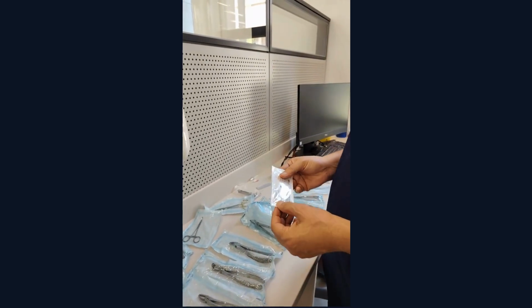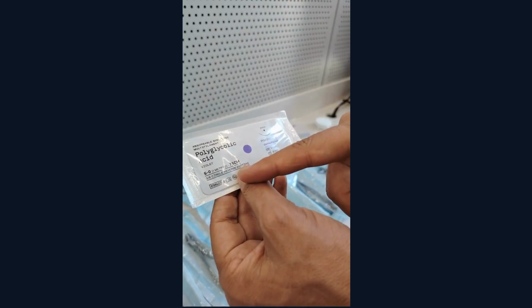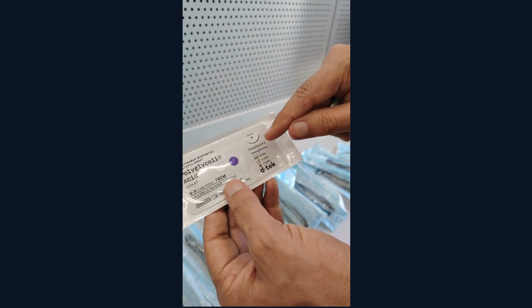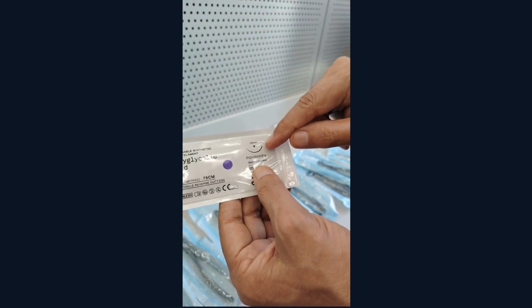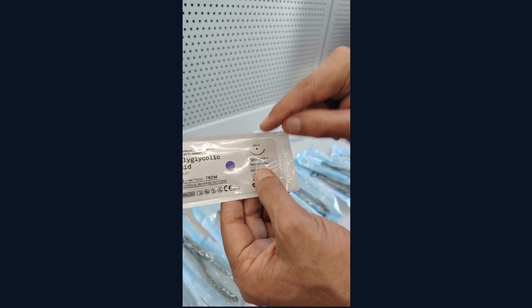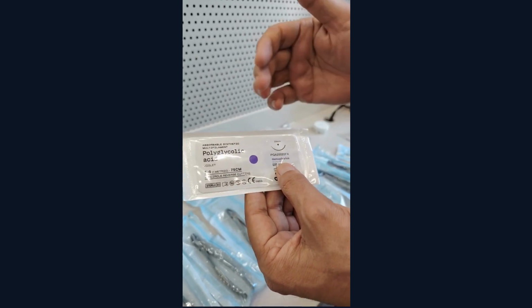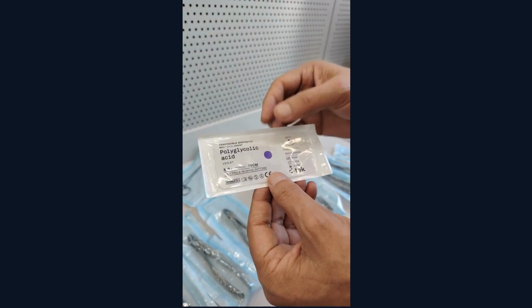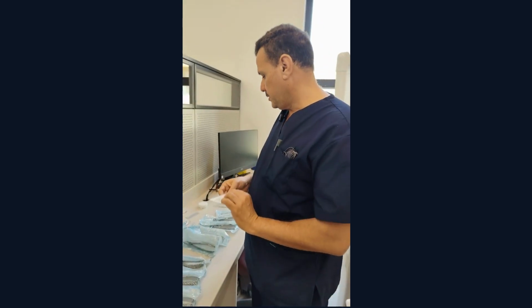Okay. We'll talk about sutures. There's polyglycolic acid. There's absorbable, non-absorbable. You can see the curvature of the needle here. This is the size of the needle. This is a cutting needle. It's not round. You can see there's a triangle, so it's a cutting needle, and you can tell what you're going to need the suture for. Maybe we can do one lecture. It's all about needles.